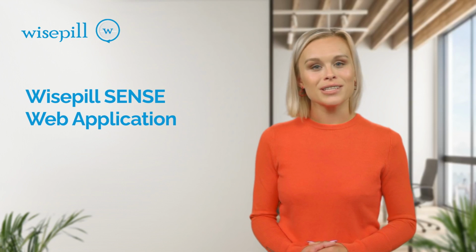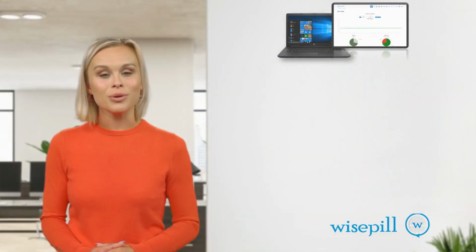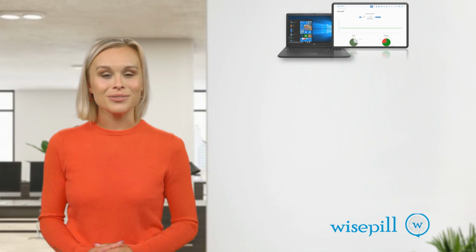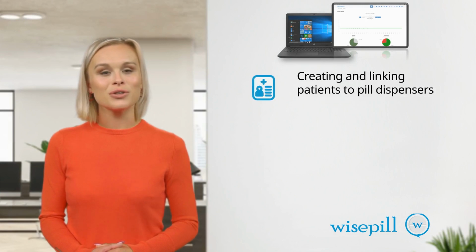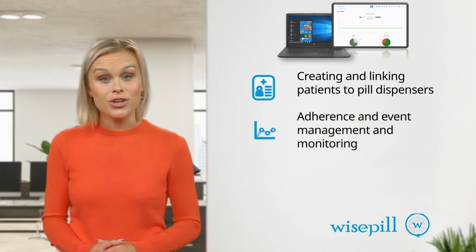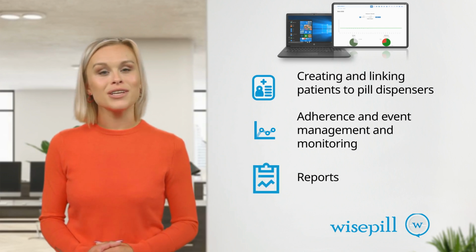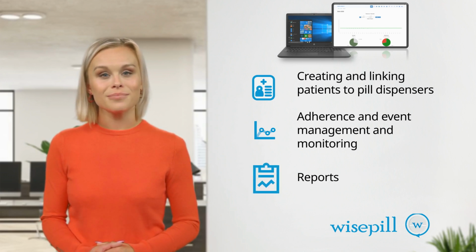The application is a powerful tool to manage and monitor the Wisepill range of online smart pillboxes and dispensers. Today we will be covering the following key subjects. We will start by learning to create and link patients to pill dispensers. We will then briefly learn about medication adherence management and monitoring. And lastly, we will look at the various reports available.